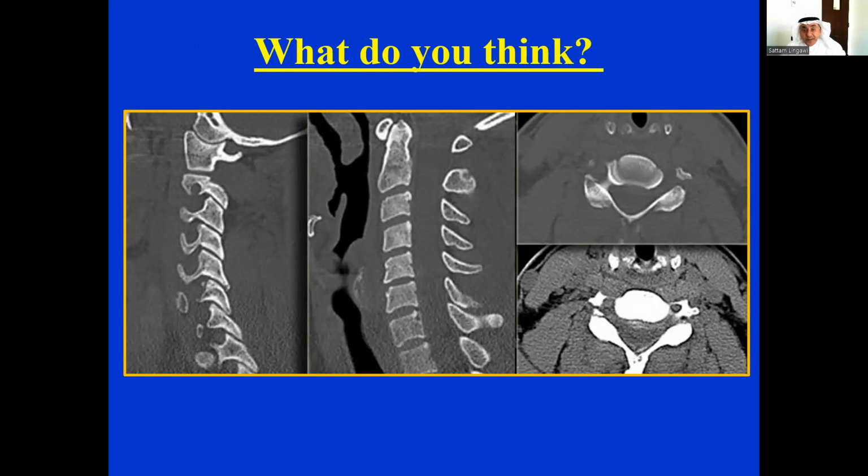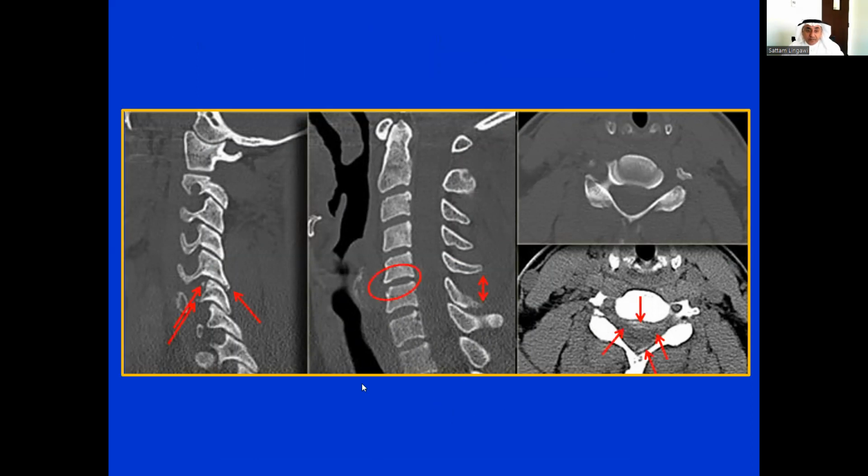However, not every case is straightforward. So how about this case? If you look carefully, you can pause the video for a minute and look at this before going to the next slide. Sort of an eye sharpener test. However, for sake of time, we will proceed, and you can see that there are multiple findings. There are multiple chip fractures.